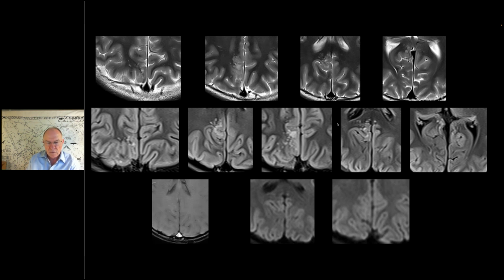But they don't suppress on T2 FLAIR, so it cannot be a perivascular space, right? They don't always suppress on FLAIR, the perivascular spaces as well, at least the giant ones don't suppress. But even if you give a differential, whatever differential you give, I think the team here should decide on the strategy for surveillance. This is what we all struggle with: how frequently should we be scanning, what should we be doing. Then there are those smart people who would try to put a spectrum on this and pick up some peaks. I think you should do as barely minimal as possible, and maybe just do it in a year's time and then keep doubling that interval.